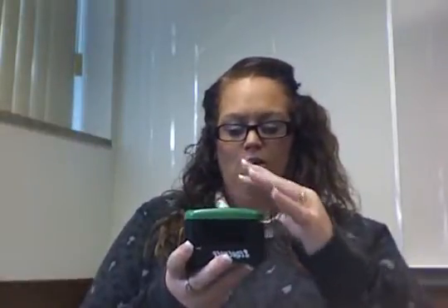All the child has to do is hit the top button, this green button right here, and this will speak as if it's their voice. I've already recorded a saying, so let me just make sure. Here we go. If someone meets someone that they maybe know or don't know and they want to interact with them, they could just press this button and this will do their interaction for them. So they press this button and it says, "How are you?" That allows them to interact with that other person.